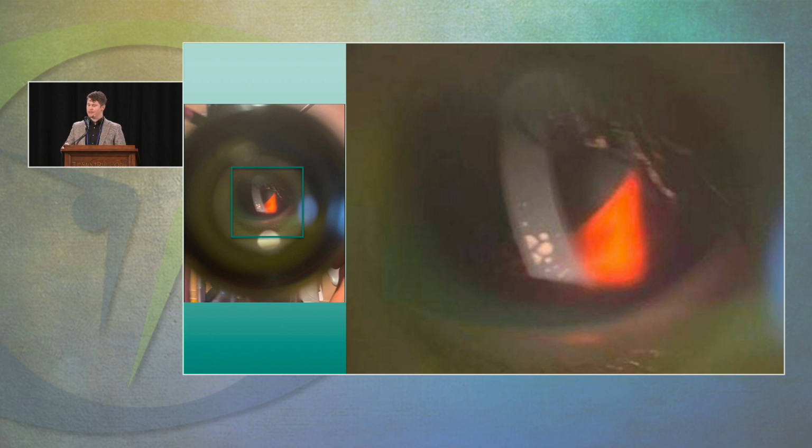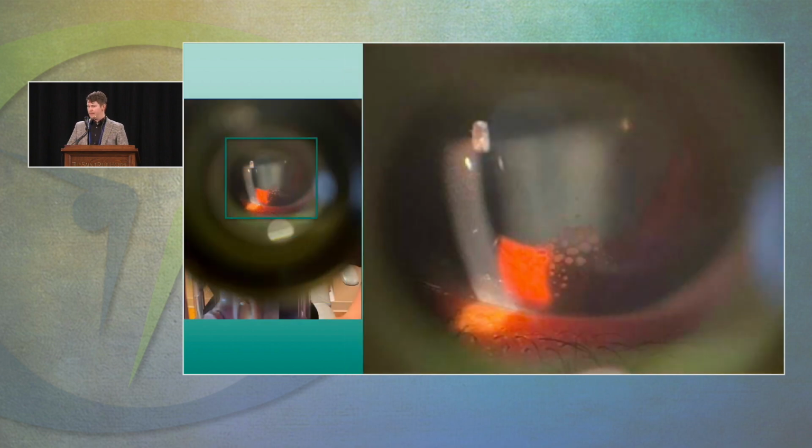So I was able to see this patient before I could see this patient, right? Really cool, interesting type of KP here. They kind of look like cobblestones in that inferior angle. I don't know if you can see that kind of square angled pattern that they have. And that's atypical KP, right? They're cobblestoning, they're large, they're at least mutton fat. So what's going on here?